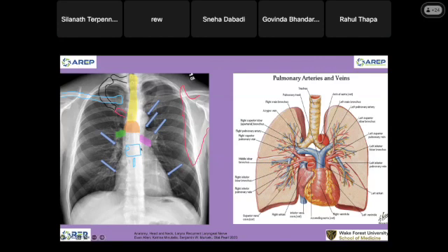The sternum is right here, and the heart border is here. The rest of the airways come from the bronchus intermedius. From the bronchus intermedius it will divide into the right middle lobe bronchus and the right lower lobe bronchus. Sometimes you cannot see the border of the heart well, like with a left ventricular aneurysm, because the heart is just so big.